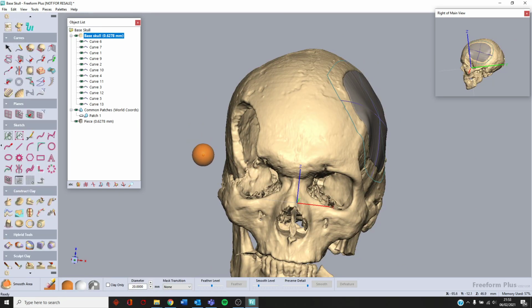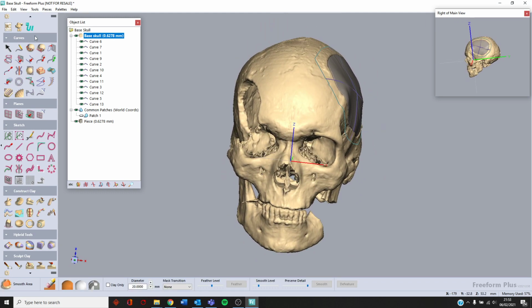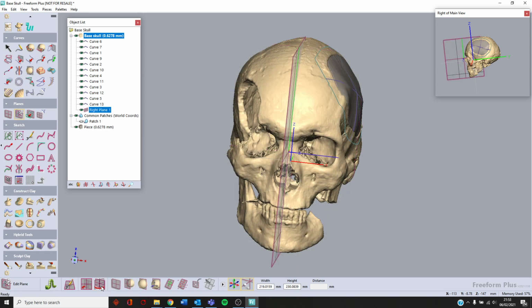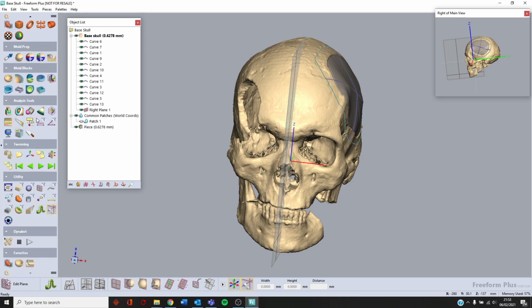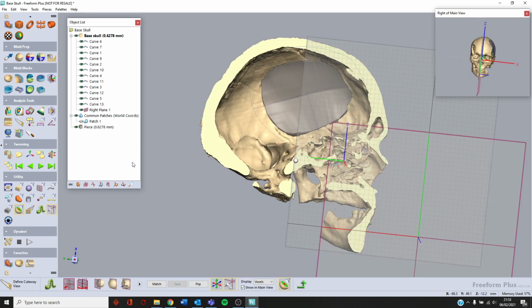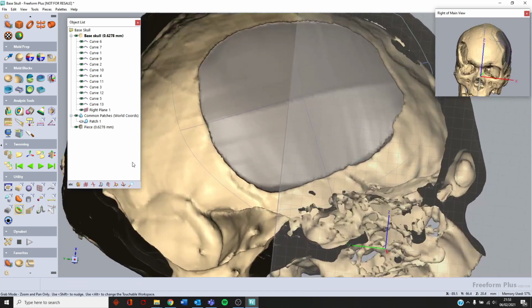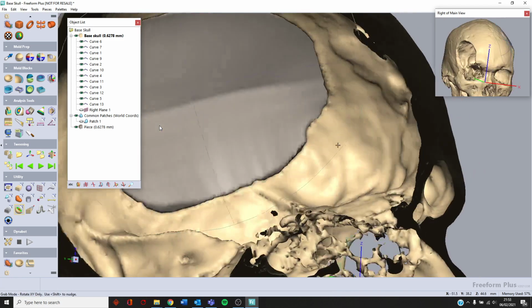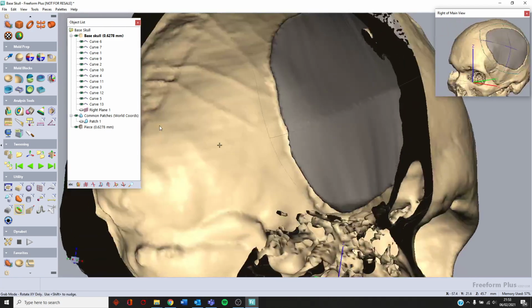The way I'm going to do it is create a cross-section view by adding a plane on scope, position it through it just like this, then scrolling down to the Analysis tab, use the Define Cutaway View, and by default that plane will be selected for me. Okay, so I'll make sure I've got that accepted, then hide the plane, and that's what's happening on the inside of that model.